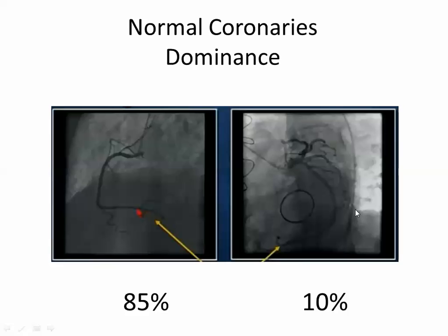So what are the walls? Septum, anterior, lateral, inferior. Okay. Yes. So this is what we call the spider view. It's like a spider.